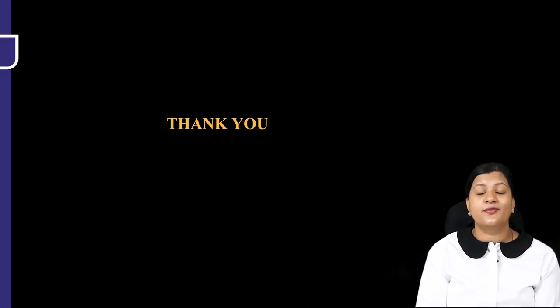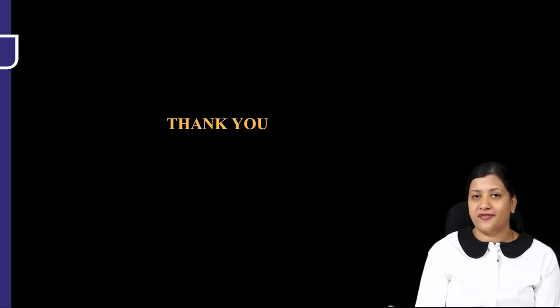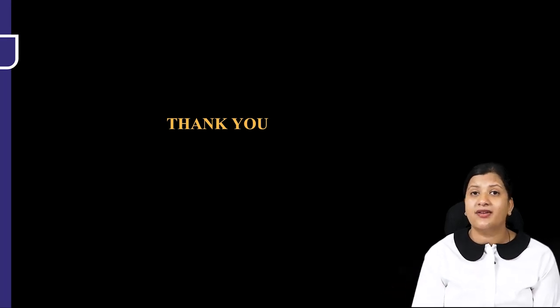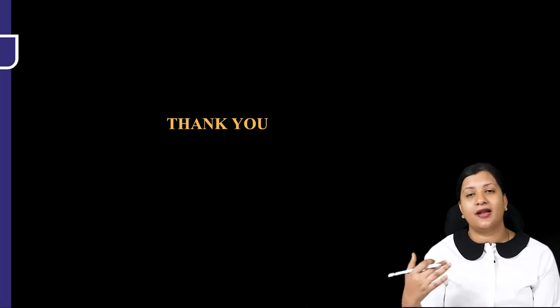So that completes most of the important radiological images that you need to know for your examination. Whilst there can be many, we have summarized the most important information for you in one place, so that when you are going to examination, a quick revision of all of these images will help you to a greater extent. I would always say that once you have done this for the first time, and when you're doing it a second or third time, go through it very quickly on 1.75x speed also. You should be able to look at the image and get the diagnosis and the related aspects of it in your mind immediately.